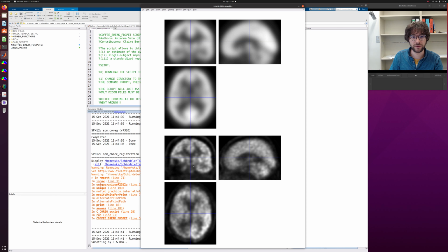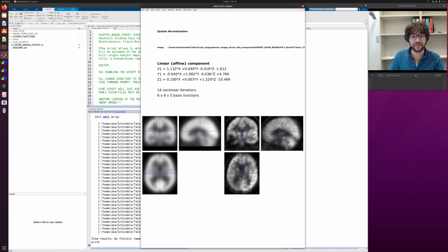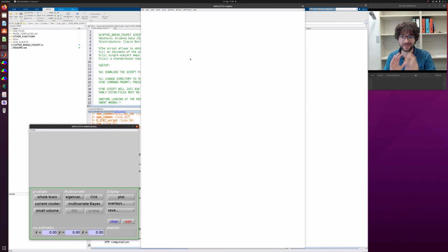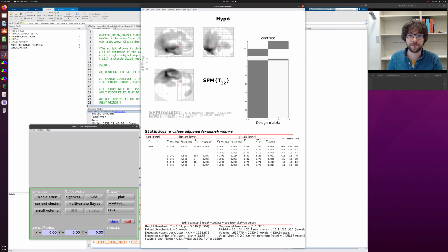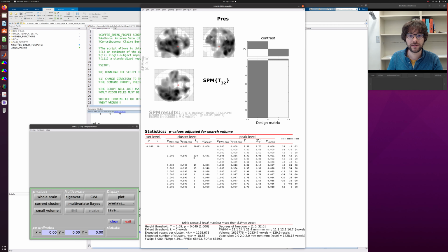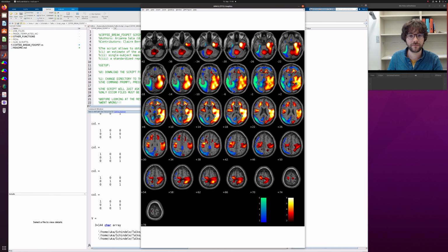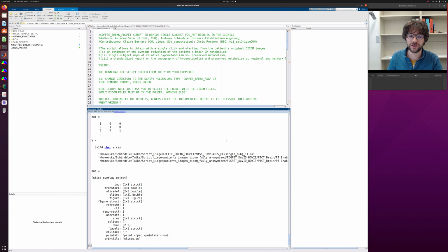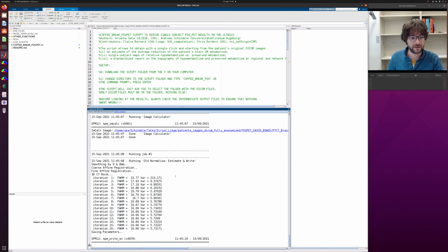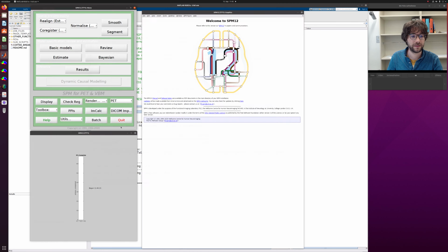Here we see the co-registration is done. Now it did the normalization, and there was the formula for how it was normalized. Now it does the statistical rendering, statistical comparison, and now for the preserved areas the same. Here are the slices. I will show you all the images later. Okay, and now the SUV was calculated, and now it's done.